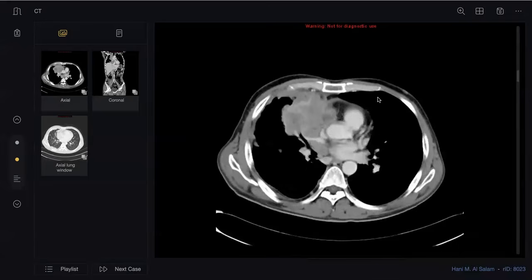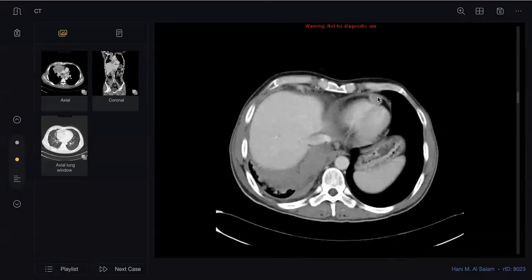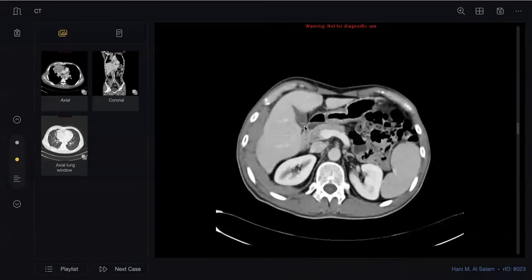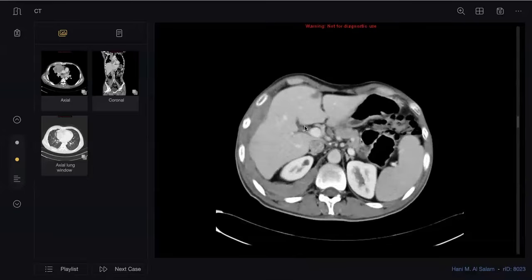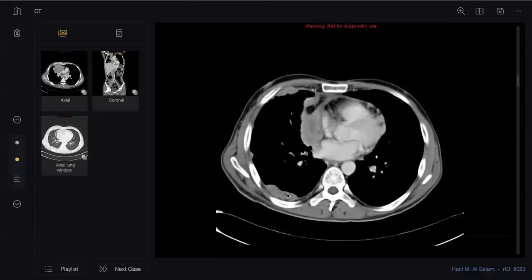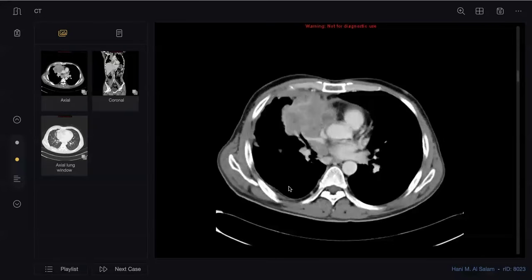Okay, so from the images, this confirms an anterior mediastinal mass, an invasive anterior mediastinal mass, which is seen to have pleural seedings in the right pleura and encasing the lungs. I would pause on the mediastinum, the region of interest. It's also seen to infiltrate the pericardium, and I can see some pericardial thickening, especially in the right anterior aspects of the heart. Any pericardial nodules? Yes, there are pericardial nodules.